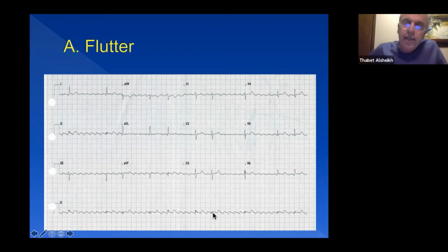And this is to highlight that 12-lead recordings are looking at the same vector from different angles. And depending on whether you're foreshortened for that vector, you may see very little of it. That's why the QRS is very small here versus much better visibility in other precordial leads.